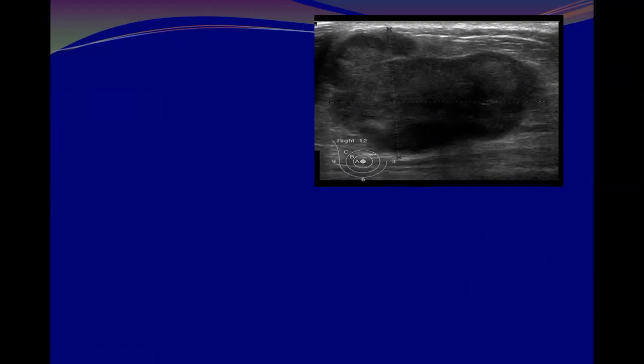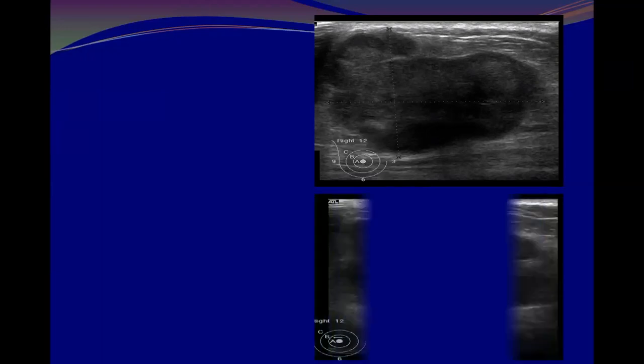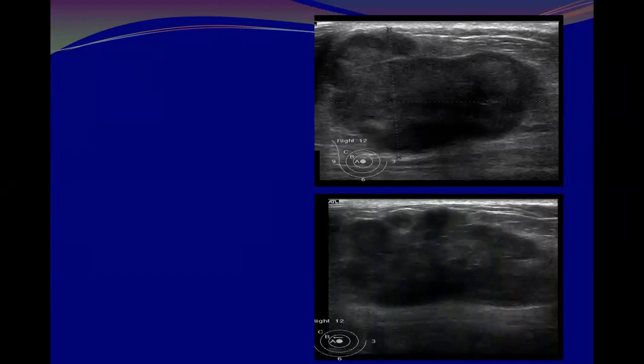So I expect from you to ask me for more images. Yes. More images and history of the patient, before deciding. I ask you, is it a fibroadenoma or cancer? Definitely from a static image. Last time we said from a static image, a single image, it is difficult to decide. Yes? Yes. Excellent that you mentioned these lesions.